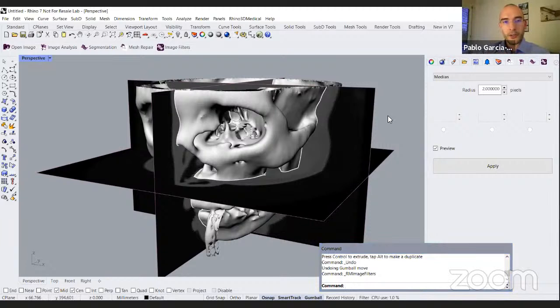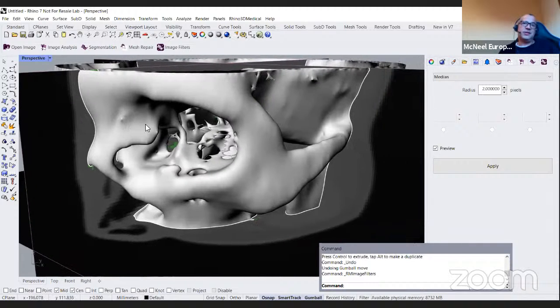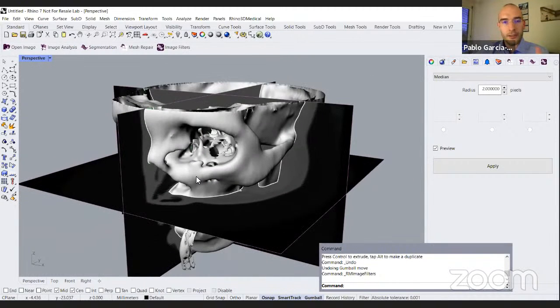No, but this is linking to the previous question. Actually, it works through voxels. But you can work with these voxels later as well, because Rhino doesn't support voxels. Yeah, I should see how these Grasshopper plugins work. But if there's a way to make this voxelization compatible with these plugins, then it should be possible. To join forces. Because what you see here in the end is a matrix of voxels, and then a way of converting them into meshes.